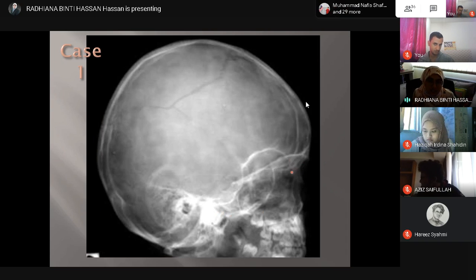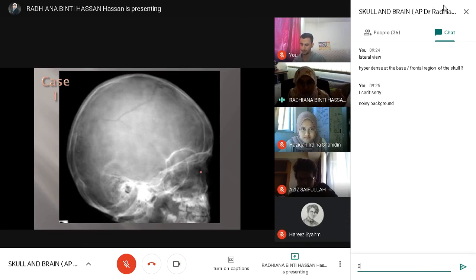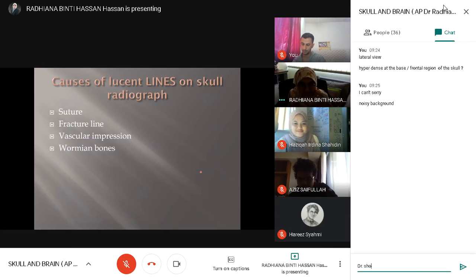This is a bit asymmetry in positioning. If not, you look at the paranasal sinuses, whether there's any fluid levels or not, to indicate fractures involving the paranasal wall or something like that. So that's how you answer. So that's how you get all the 5, 6, 7 marks allocated. So it shouldn't be only 1 or 2 sentences.